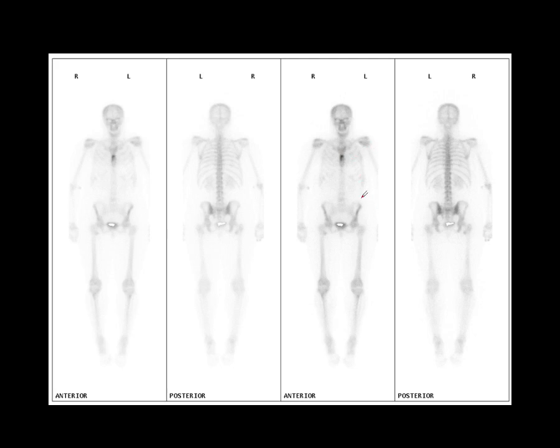This is the classic appearance you see in tumour spread from breast cancer, and it's nearly always an ipsilateral one. So the patient will almost certainly have a history of breast cancer on this side, and I don't know if it's nodal spread or some other type of lymphatic spread, but you see the tumour here on the same side of the sternum, causing an abnormality on bone scintigraphy.